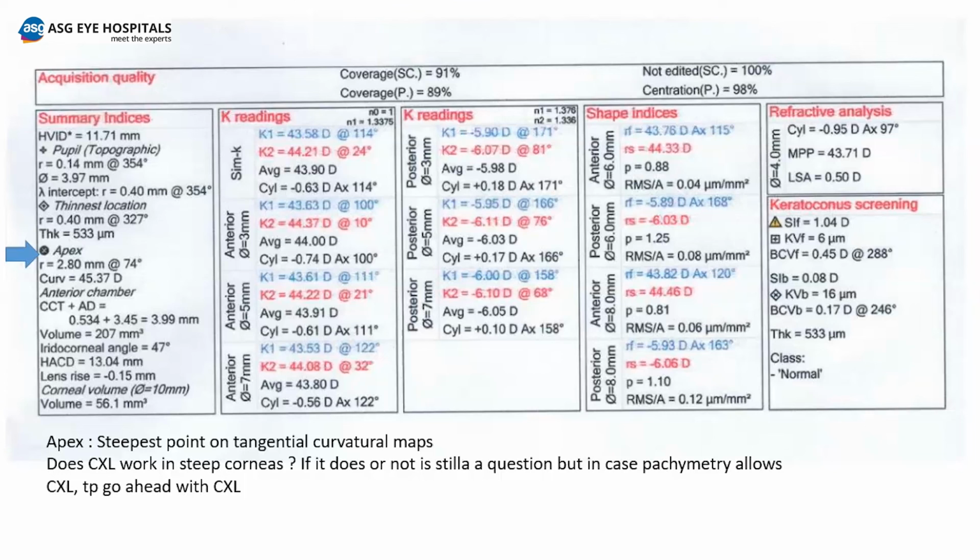So these are the things that you can compare in a very, very similar way to a keratoconus patient. And as ma'am already mentioned, delta Z is an approximate indication; there is no cutoff for delta Z at all that you see in the quad maps of Sirius. That varies a lot. Even on repeatability scans, delta Z has a very, very variable value.